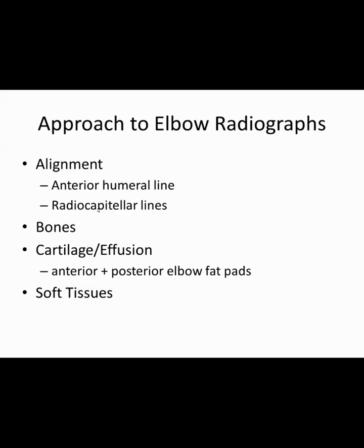And lastly, you have soft tissues / everything else, where you can look for any abnormal soft tissue masses or calcification, or even soft tissue edema. Having soft tissue edema in a region can actually raise your suspicion of a possible fracture and tell you to scrutinize that area more closely.